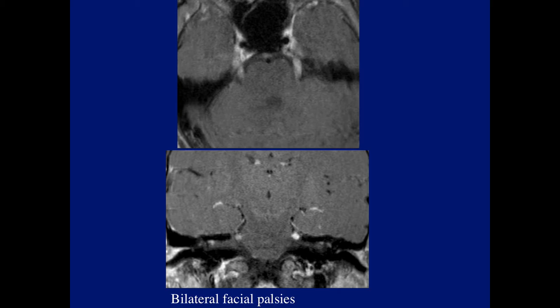Correct. Both Eric and Nate point out the marked enhancement of the trigeminal nerve. However, why would the trigeminal nerve give facial palsy? It gives facial numbness, not palsies. So what other finding is there on these images?